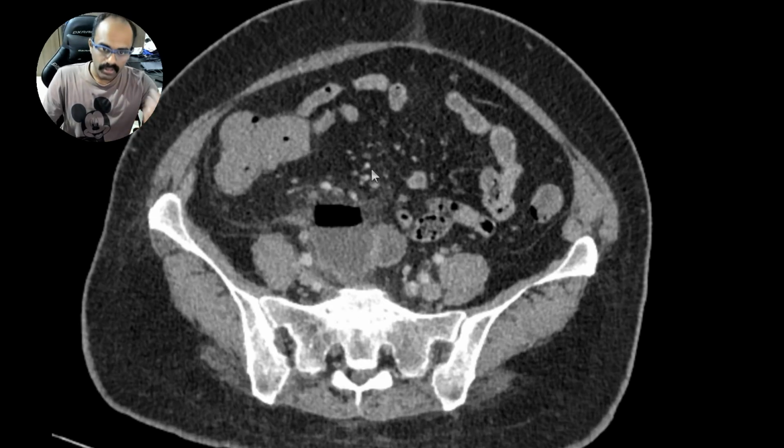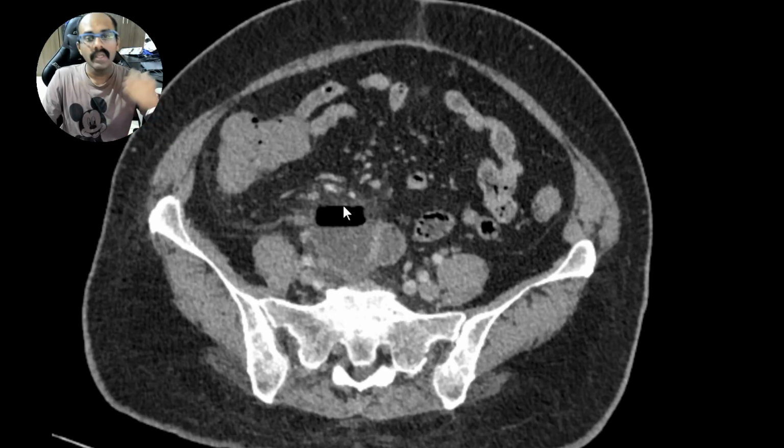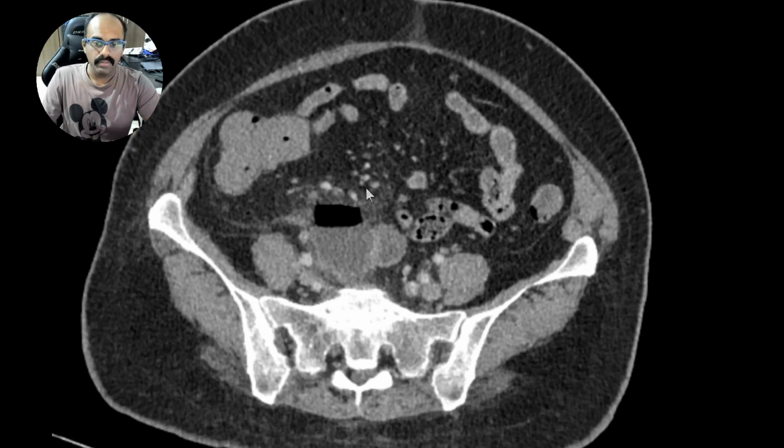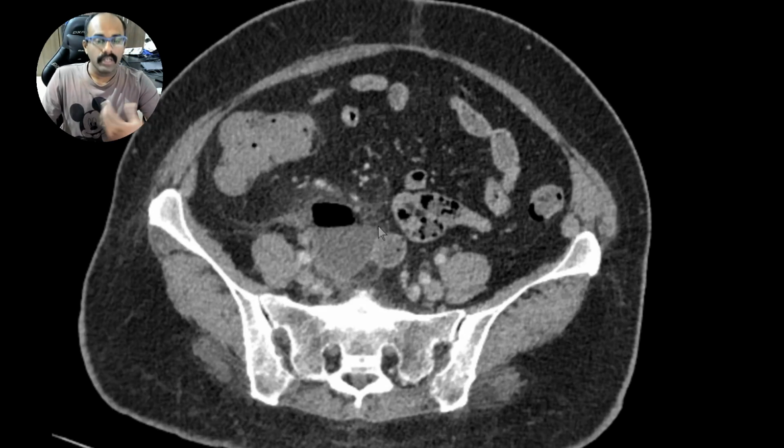If the inflammatory markers are progressively increasing and the patient is showing symptoms of an abscess, and any abscess in the body has to be drained. So a guided procedure can be done, either CT guided or ultrasound guided, depending on the available access route, and try to drain the fluid. And usually in these settings, in most of the cases, 80% of the cases, the inflammation does tend to subside after the initial non-operative management, and probably the patient does not need an appendectomy unless it again recurs. Or, of course, if you want, you can go in for an interval appendectomy.